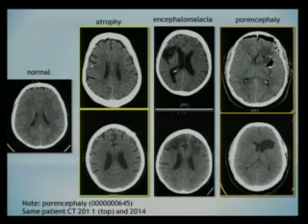So as we get older, atrophy sets in and the sulci become more obvious. Compare that with this here. And then if we are unfortunate enough to get an infarct, that infarct eventually becomes, Dr. Peter Myers, after whom the library is named, called this brain rot.